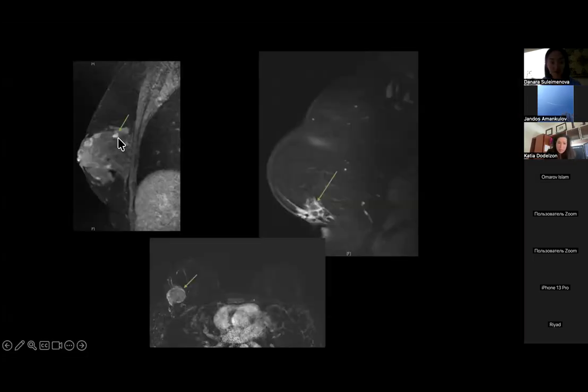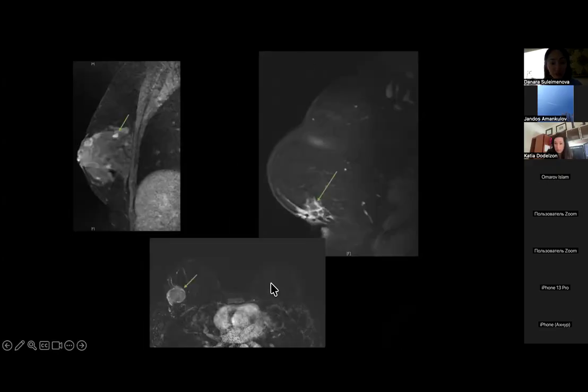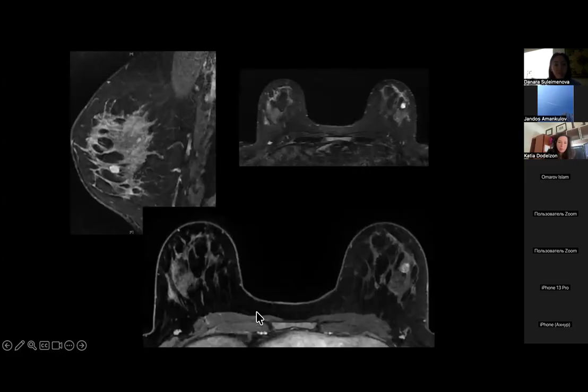So this is a mass. It's oval. It's actually well circumscribed. Its internal pattern is homogeneous enhancement. This mass is irregular, not well circumscribed, with either spiculated or indistinct margins, and it's heterogeneously enhancing. There's multiple areas, some enhancing more than others. And then this mass is round, you would argue, not well circumscribed, and you have thick rim enhancement. So any one of these, by the way, can be cancer. This one, least likely, right? But still can be, depending on the patient.